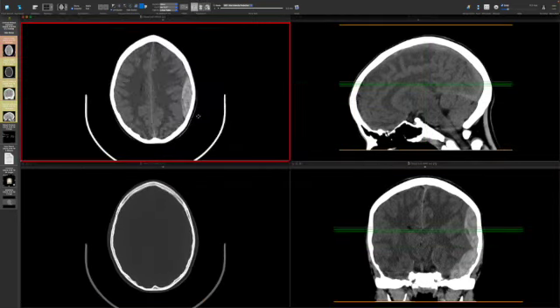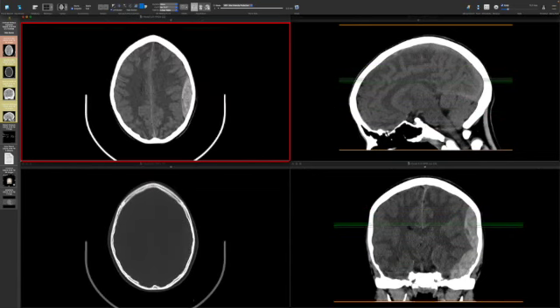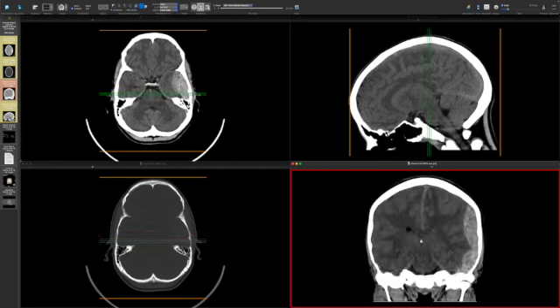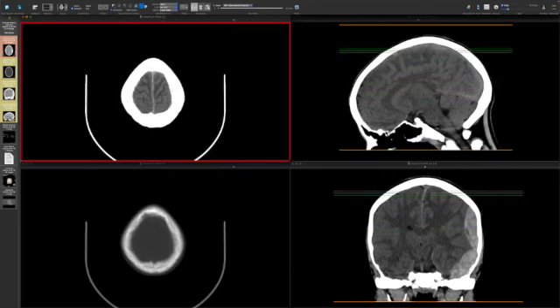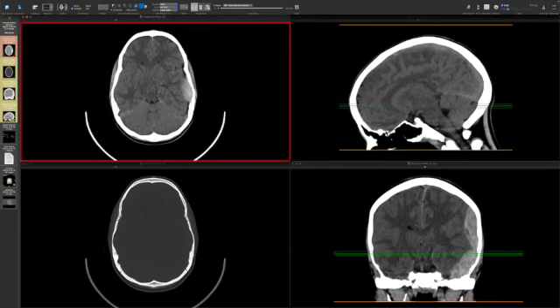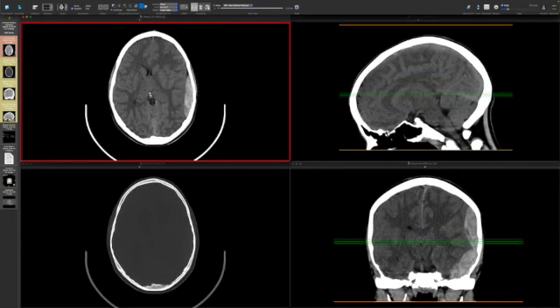So this is a large epidural hematoma. It's exerting mass effect both on the frontal and parietal lobes on the left, as well as on the left temporal lobe. You can see that on the coronals quite nicely too. There's sulcal effacement within the left cerebral hemisphere. Here, there's a little bit of room in the sulci on the right, but here, see how there's no CSF density in the sulci on this left side. You can see that there's compression of the frontal horn of the lateral ventricle here, as well as the body of the lateral ventricle on the left due to mass effect.